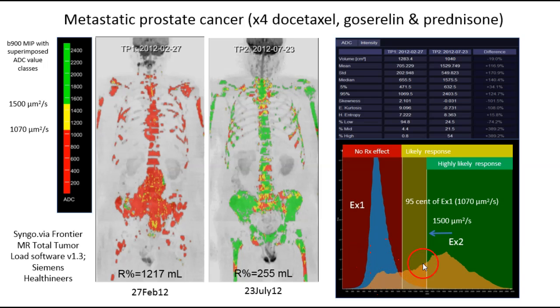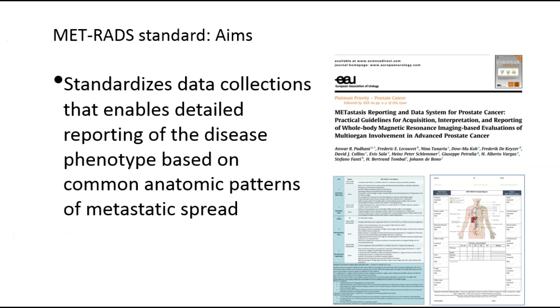But look what happens after treatment. You see an increase in ADC value. Another aim of MET-RADS is to standardize the data collection so that it enables us to get a detailed report on the distribution of disease based on the common anatomical patterns of metastatic disease spread.